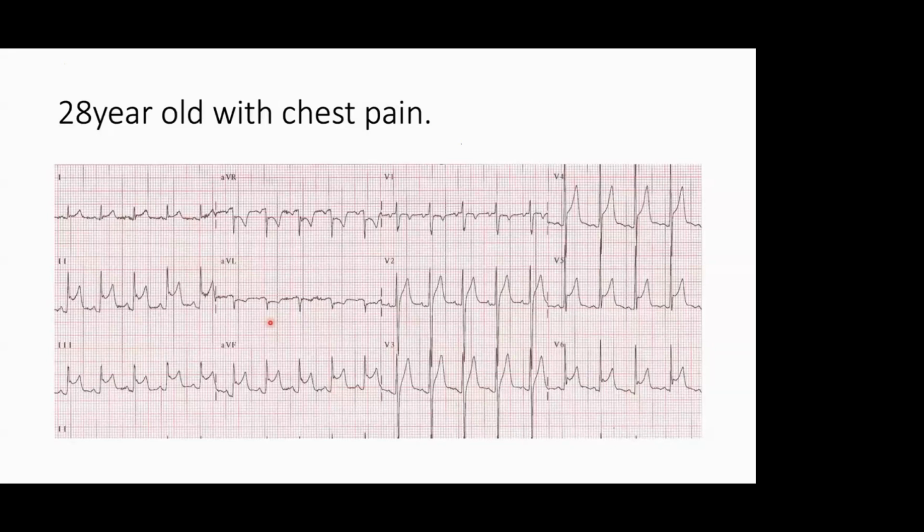Q wave, QRS height, ST segment, then T wave, like that. All three components plus corresponding ST depression. If you apply all these 5 things in a patient's ECG in these leads, you can almost certainly diagnose. You will never miss a myocardial infarction in the ECG.